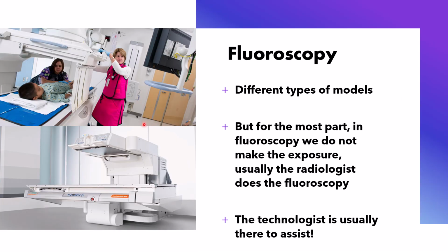Again, there's going to be many different models and different setups, but basically they're all going to do the same thing. There's a lead curtain here that protects from the scattered radiation. There's a barrier here, a shield here, and then we would wear a lead shield ourselves, with the monitors on here.